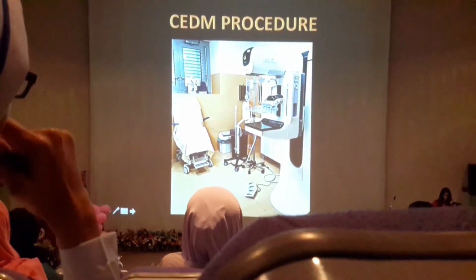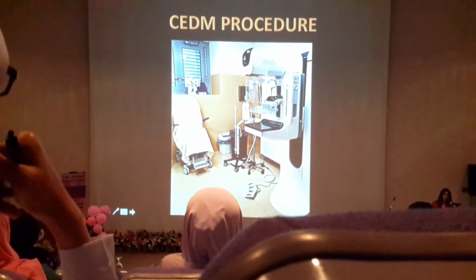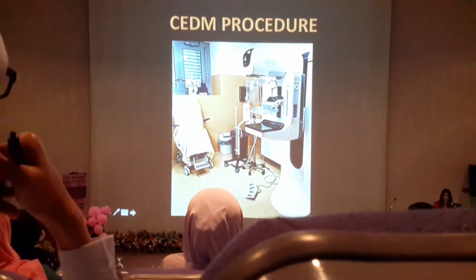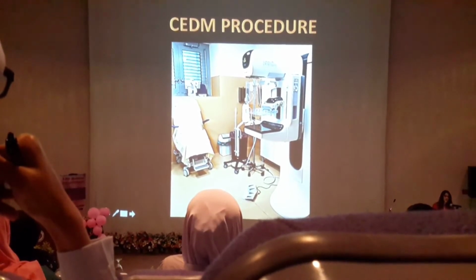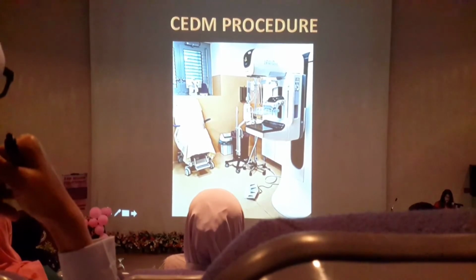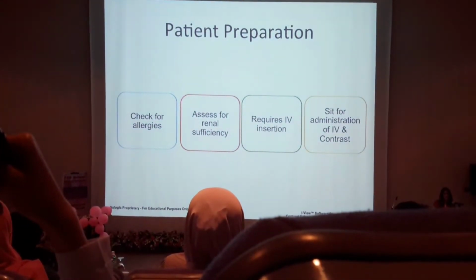This is our setup in Italy. The patient will be seated on this chair. There is an injector not far from the patient, and that's our mammogram machine. She needs to be seated close to the mammogram machine because after IV injection of contrast media, she has 2 minutes to be able to walk to the mammogram machine to start her mammograms. So just like how we do a CT scan, the same procedure happens here.